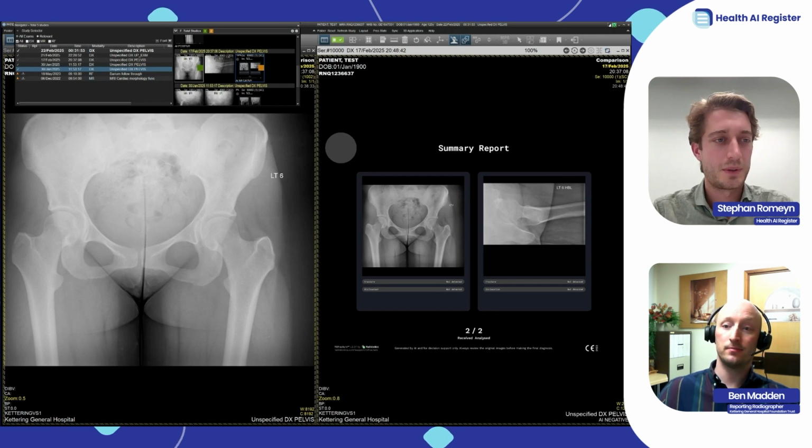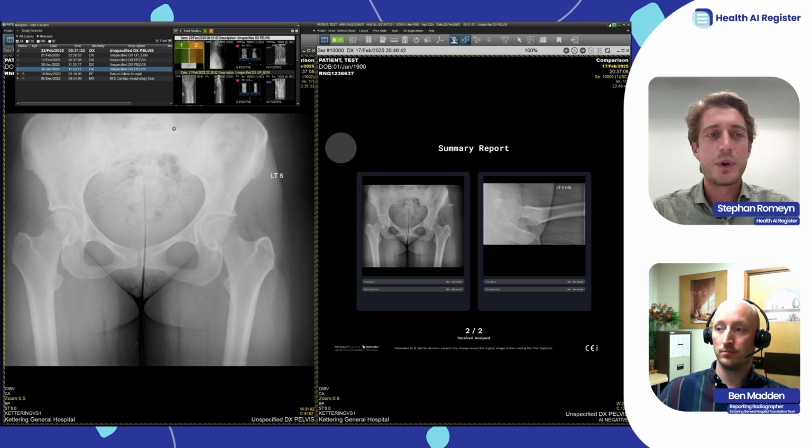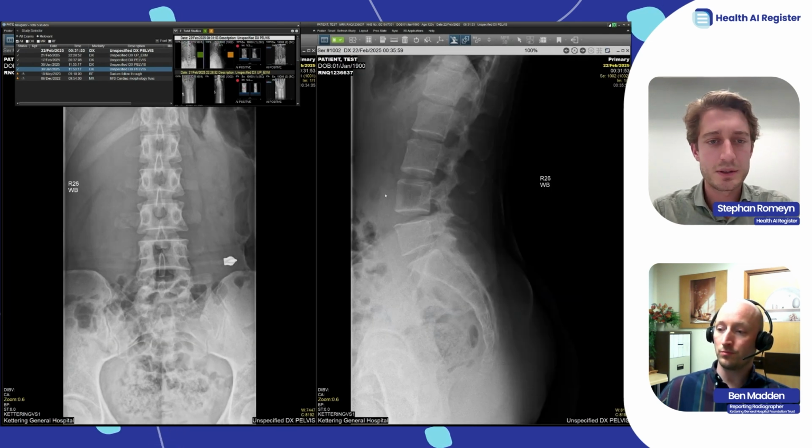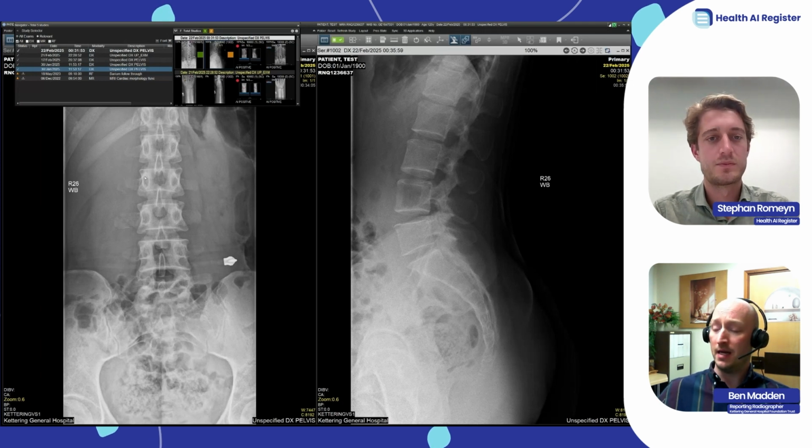Absolutely, yes. All right. And the first one you also showed that it missed a finding. We all know, of course, that AI is not perfect. So how do you deal with that in clinical practice? In this case, if it misses a fracture, then when we report it, we have an audit system in the background. So when we report it as there is a fracture, and RB called it not a fracture, we have an audit phrase at the end where ED can then pick it up and change their management if required.